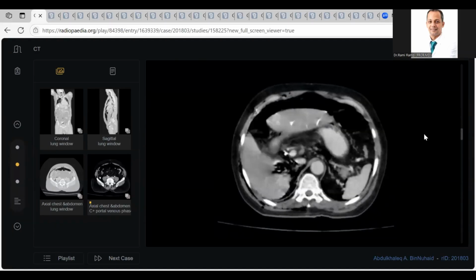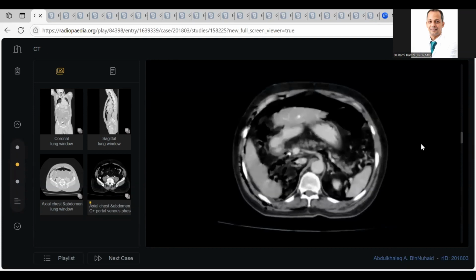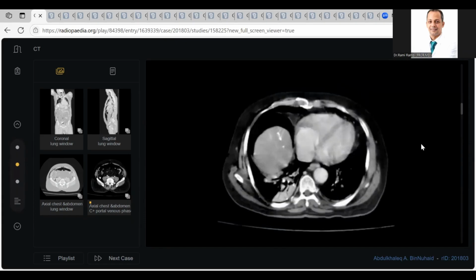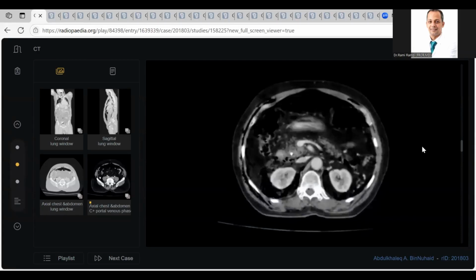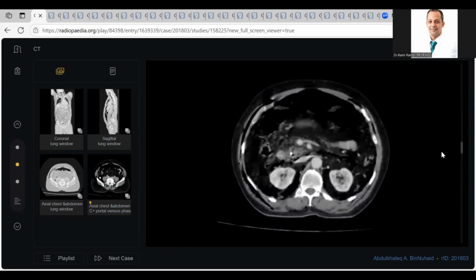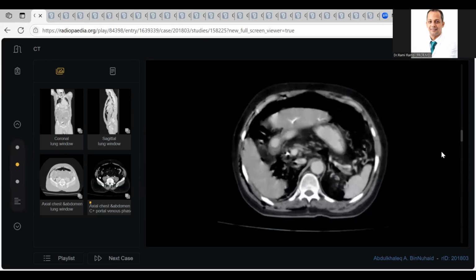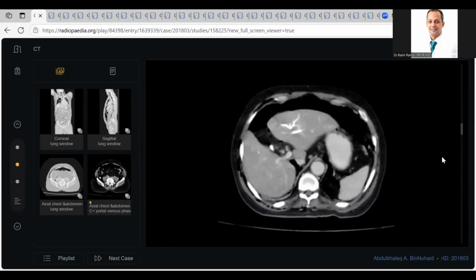In the gallbladder, there is a significant collection of contrast, and also in the biliary tree. I think any recent ERCP or some contrast study was done for this. Apart from that, I see some tube. So instrumentation has been done. I see the tube running through the course of the CBD.